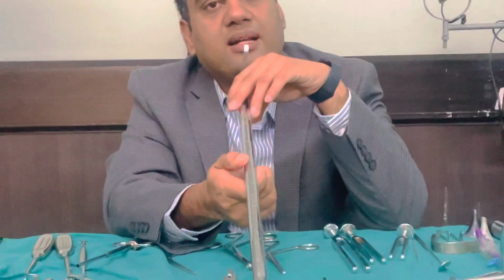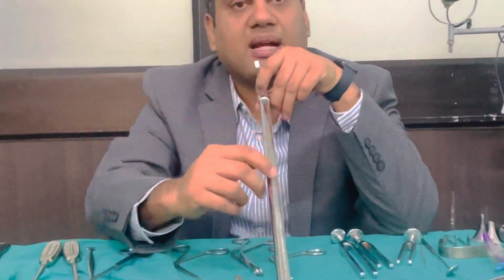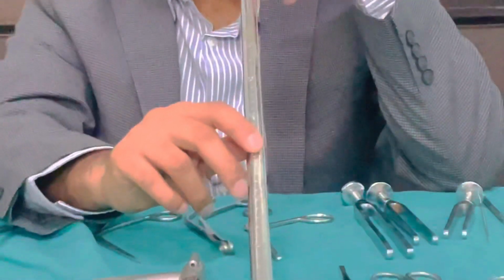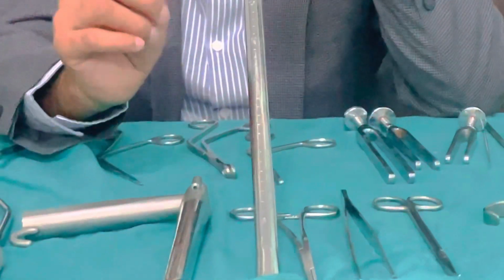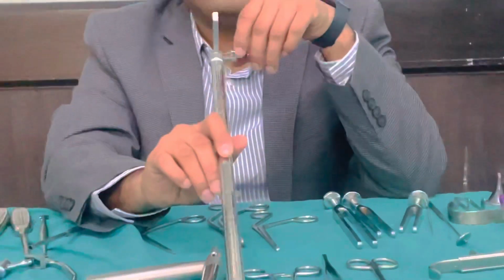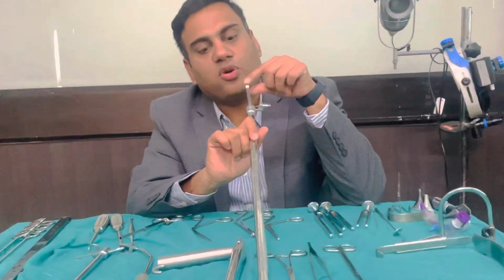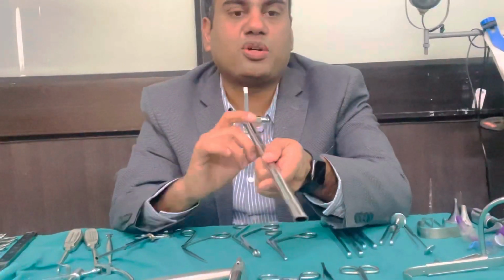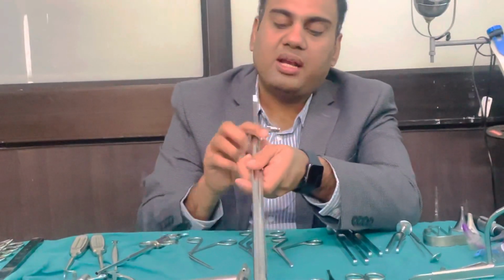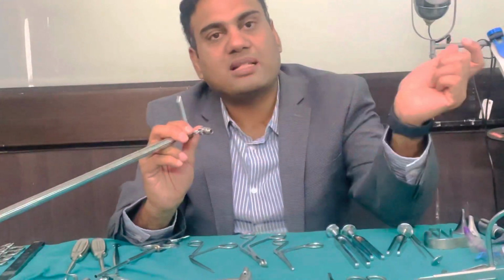This esophagoscope also has markings on it because that will help you identify the level at which the disease is when you do an esophagoscopy. The projection on the proximal end, of course, is for the orientation of how the beveling is inside the body. Now, illumination for both bronchoscope and esophagoscope is through a prism, through an external light source.